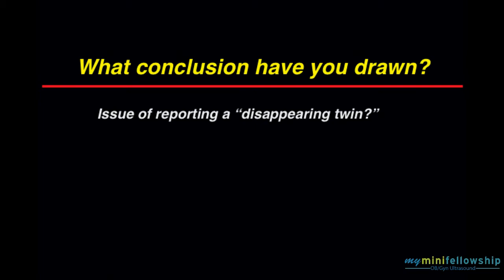Okay. So look, I would not disagree that everybody would report this as a pregnancy that had one sac that had no embryo within it. But I can assure you that this turns out to be something that women respond to in an unusual way. I have literally heard a woman telling her child that her twin died in the womb.